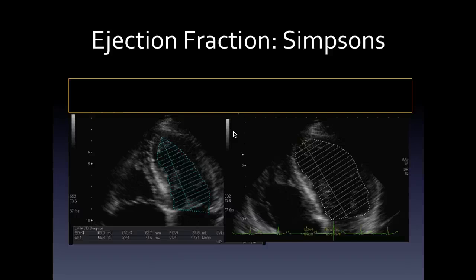Again, it has to be taken into consideration. In these views here, you can miss a posterior myocardial infarction in its entirety. So using this methodology, you'll get a normal left ventricular ejection fraction if the patient has an acute posterior infarct, because you don't get that wall in this view. And that's a significant weakness. So as I said, it's really not perfect.